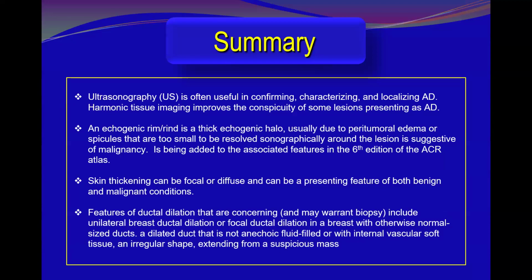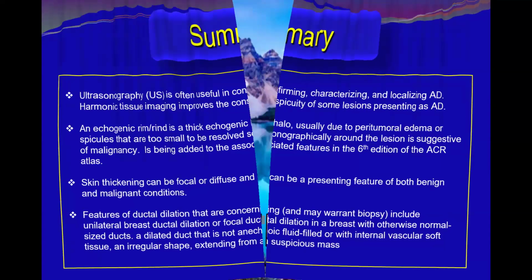And finally, features of ductal dilatation that are concerning and warrant biopsy include unilateral breast ductal dilatation, focal ductal dilatation in a breast with otherwise normal duct size, a dilated duct that is not anechoic, with internal vascular soft tissue, irregular outlines, and ducts extending from a suspicious mass.